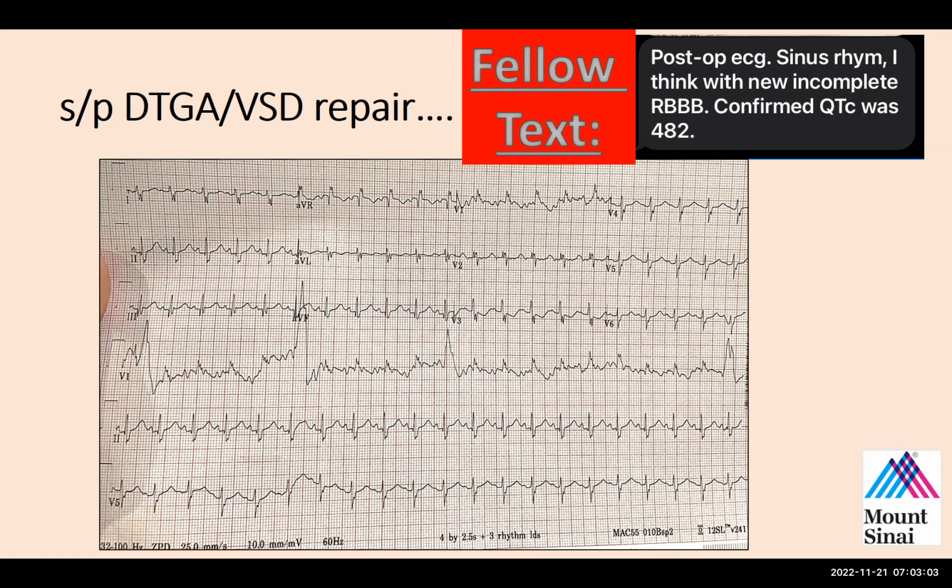incomplete portion, I would say yes, I agree with that. Why do you think this patient has an incomplete right bundle? Can you come up with a theory for that? I will just tell you pre-op there was not. Yeah, because of the VSD repair, most likely. So there's delayed conduction from the repair. That's correct. There can sometimes be some injury to the branch as a result of that.